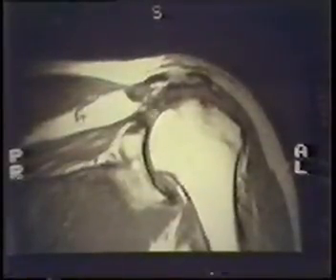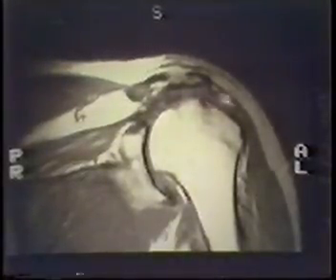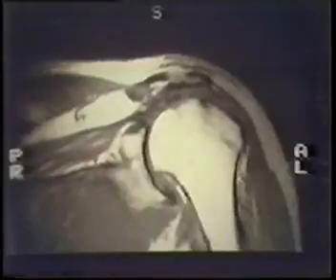At this point, it's difficult to repair because the other thing that MR can do is tell the surgeon roughly how much separation there is in the tendon tear, which he would like to know before he goes in for surgery. And in cases where there's a lot of fatty degeneration, very often this muscle is not stretchable enough to really bring it back and create a good repair. And this is someone who's had multiple surgeries because of that. And on a T2 weighted image, we can see fluid in the area of the tear.